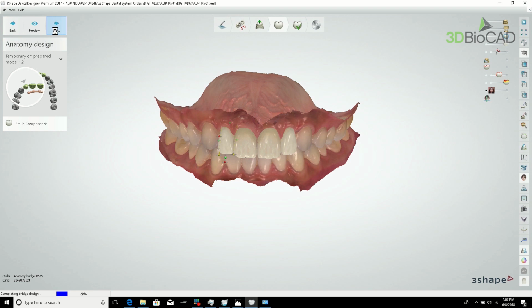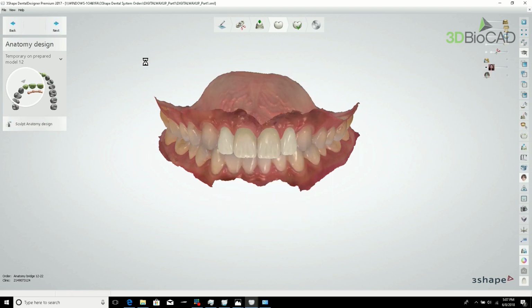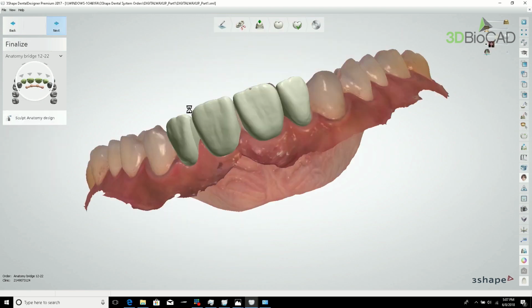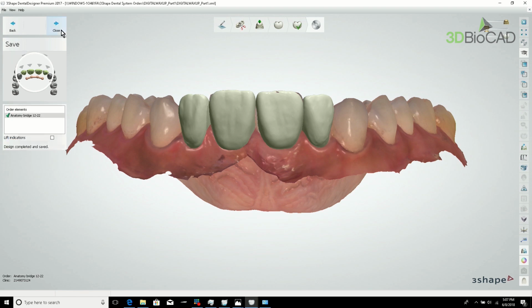Just wait a little bit. Pontic proceed anyway, yes. We will not care about anything, just go next. And just close.